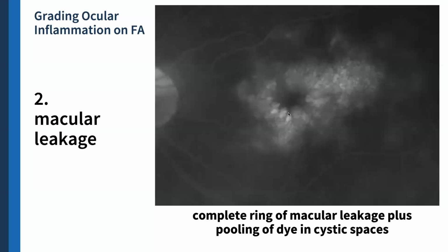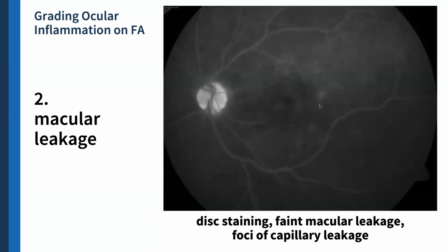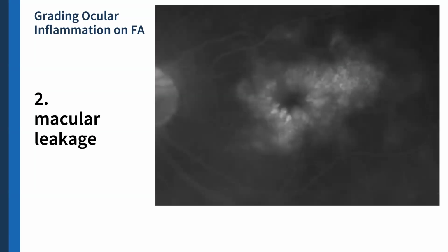Okay, so if you take a look at the past few pictures, you would think na, oh, it's just macular edema, but ito, again, take a look at the disc. So it's a hot disc. So pag nakita nyo yan, you might want to think, oh, there might be an inflammatory process going on there. Okay, similar to this one, it's macular edema associated with a hot disc.